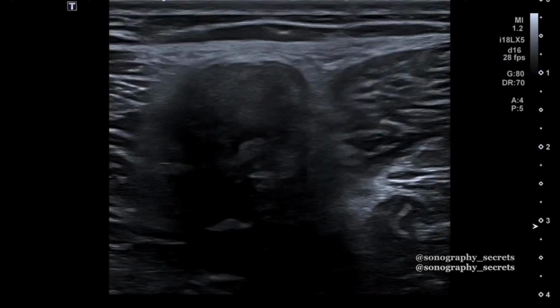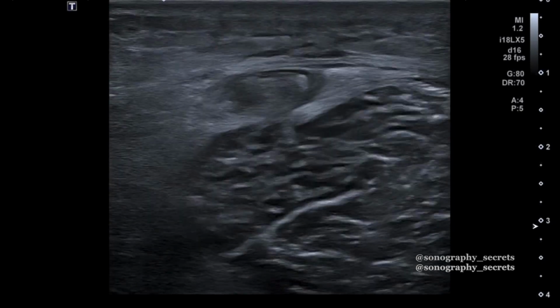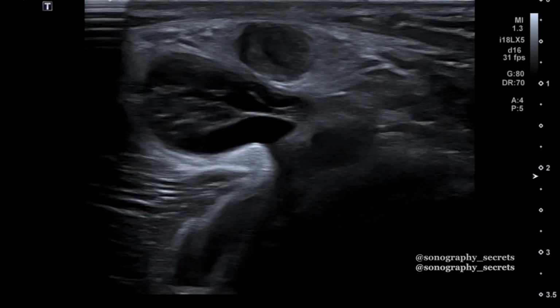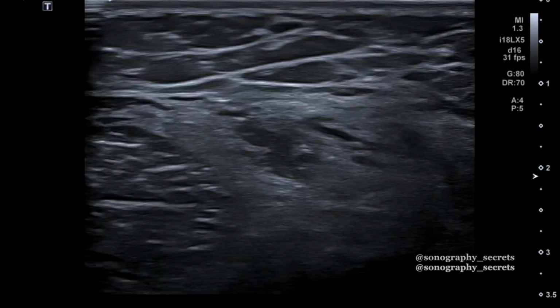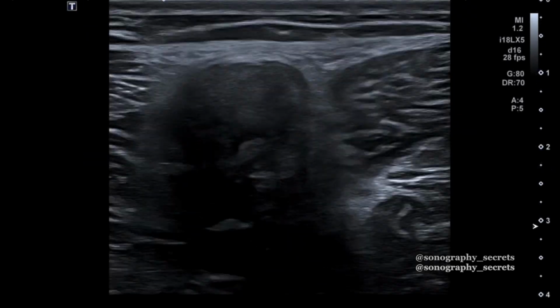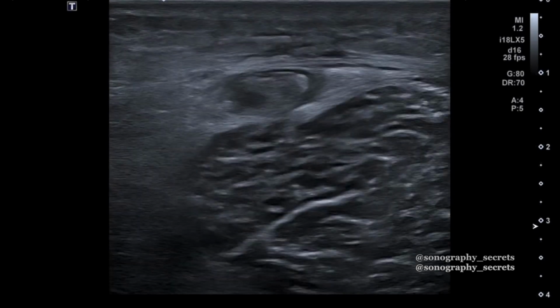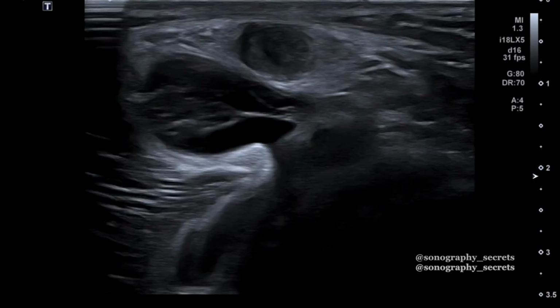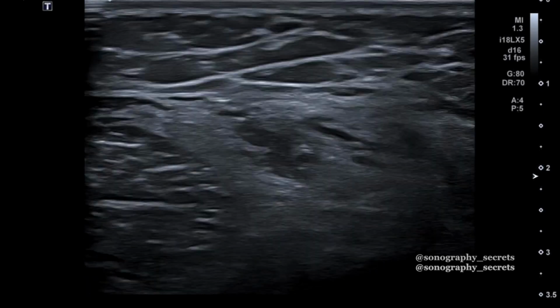This was an athlete 2 months post ACL, just doing some minor rehab, and you can see basically a complete tear of that semitendinosus. So sometimes the surgeons will grab too much semitendinosus. That's not their focus. Their focus is on repairing the knee. So what often happens is the semitendinosus and the hamstring will fail in the 12 months post ACL reconstruction.